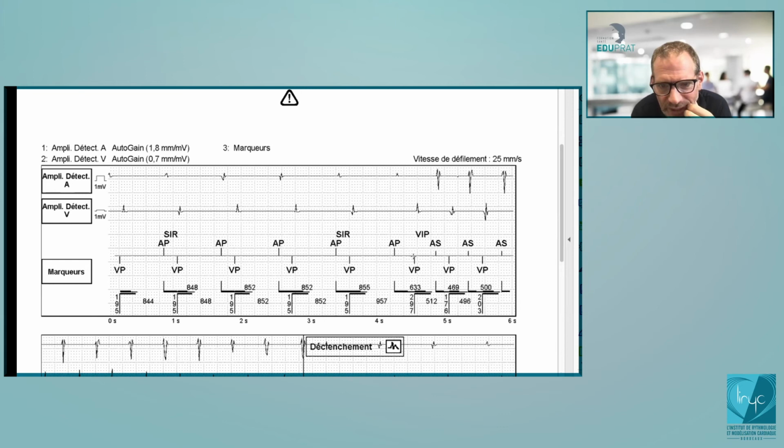You increase the duration of the AV delay on 1 beat, and in this patient, it will favor the retrograde conduction. So if you remember the EGM that I've shown you on the programmer, there was a PMT because there were two PVCs. Okay, so specific problem, desynchrony between ventricle and atrium, PVC, desynchrony, and then PMT. The problem here is that there is creation of a PMT just by prolonging the AV delay, without a need for a PVC or a premature atrial contraction, just prolongation. And this favors the retrograde conduction.